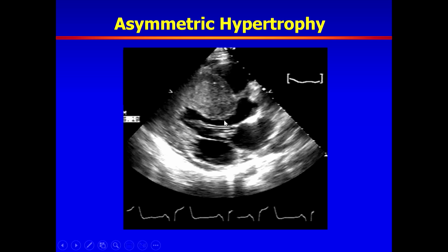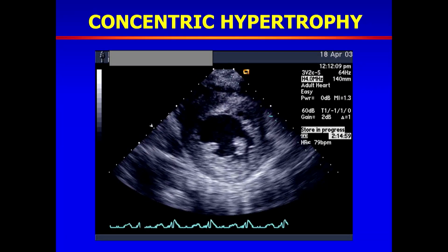Asymmetric hypertrophy and reverse curvature phenotype are pretty outstanding if you see them. And if you see a case like that, it's not a challenge. Most cases of hypertrophic cardiomyopathy will have the asymmetric pattern, not the concentric pattern that is shown here. Sometimes we read reports that say concentric hypertrophy. If you see a patient, say, with hypertension, the hypertrophy pattern in these cases is more frequently concentric rather than asymmetric, but maybe 3 to 5% at most of cases of hypertrophic cardiomyopathy can have concentric hypertrophy.